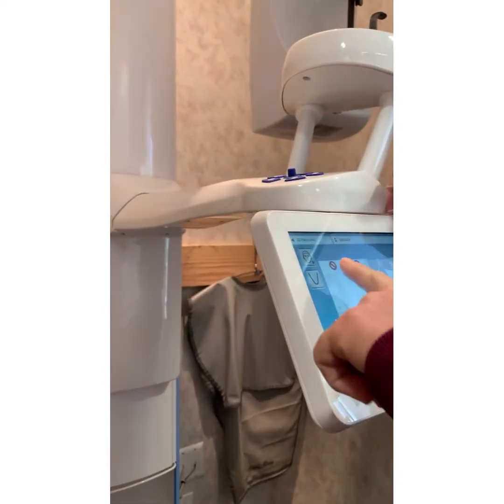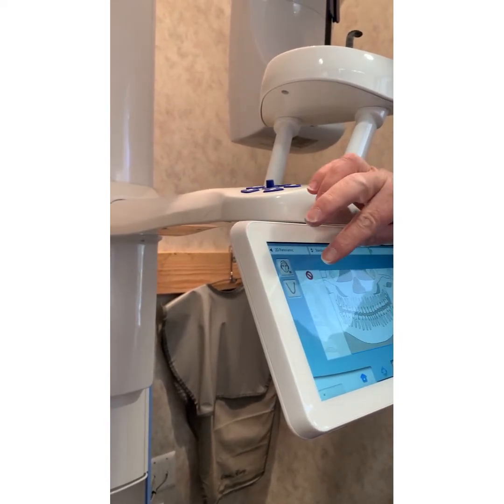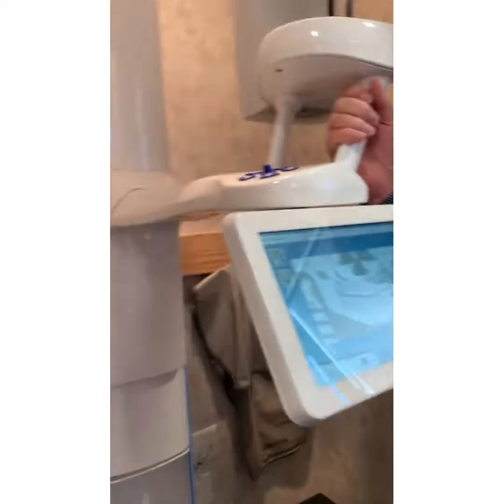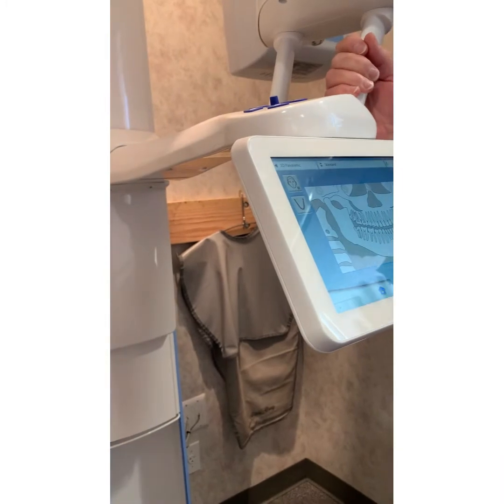That would be great for young kids, or for a novice. You go and select each area. It's just another way to get places that you may not be able to reach. But don't get rid of your sensors. Use all the tools you get.